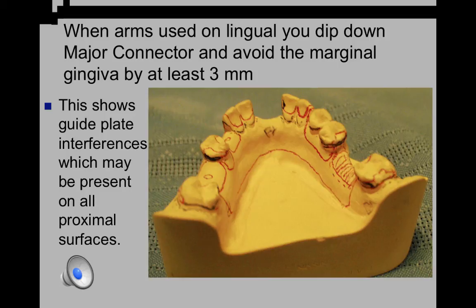If on the marginal ridge your survey line is right there up at the top of that marginal ridge, that means that from there on down it's an undercut. And you want the metal in the guiding plane area to be able to touch the tooth along the side of it a minimum of 2 to 3 millimeters along that back side.